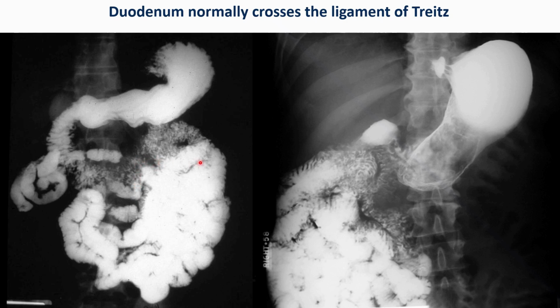And we also talked about how the duodenum should cross between the aorta and SMA and go to the left of midline, with most of the jejunum and small bowel being to the left of midline. If the duodenum does not cross the midline and stays to the right of midline, you will have malrotation. All the small bowel is to the right of midline. So this may present day 1 of life with a newborn with bilious vomiting. That's always the diagnosis of exclusion, malrotation.